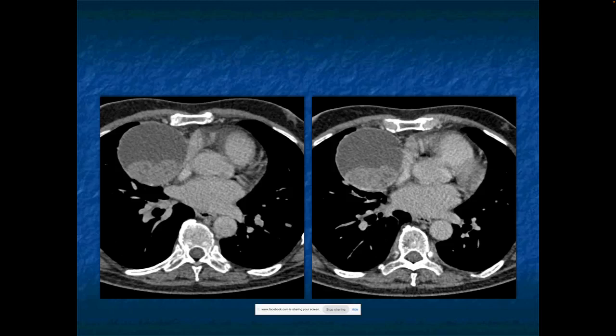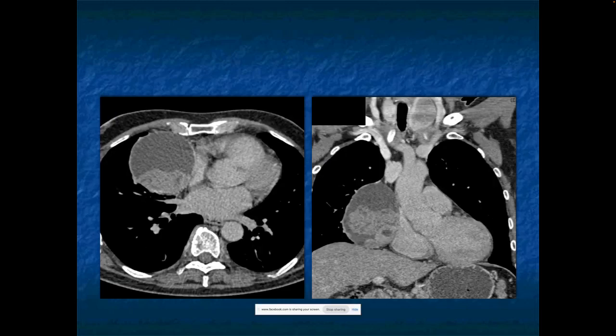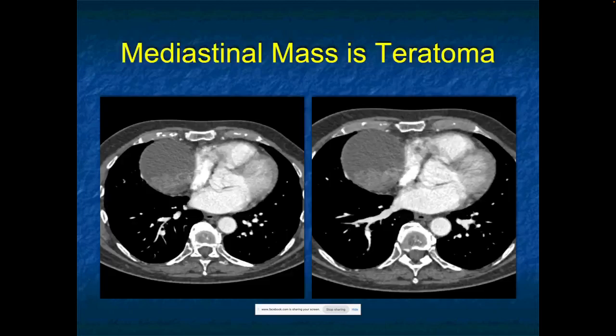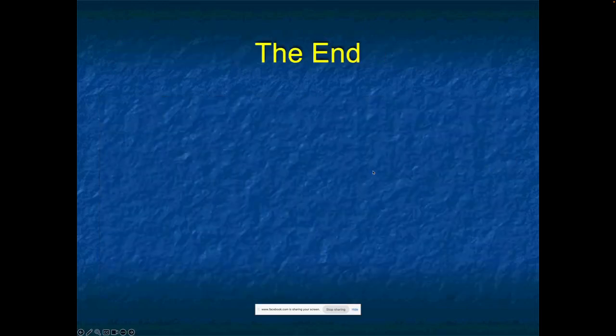Pericardial cyst, in theory, pericardial cysts can be large and they can bleed or have some proteinaceous material, so you couldn't exactly rule that out. Here it is nicely shown in the coronal view. Really good location for a pericardial cyst, not a great location for a bronchogenic cyst. This was eccentric and low-lying, and this was a teratoma. Teratomas can be cystic, have solid components, have calcification, be vascular, but it's unusual. It was so low-lying that teratoma wasn't probably the first thing you thought about.